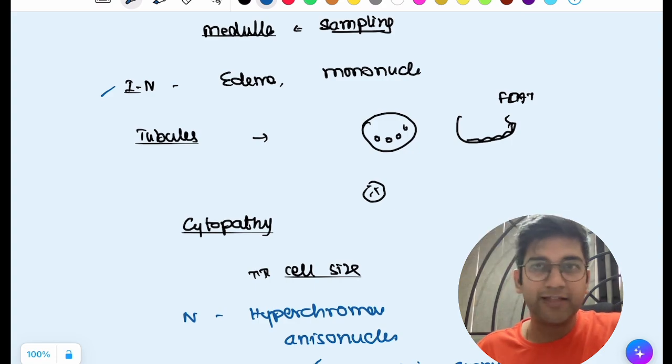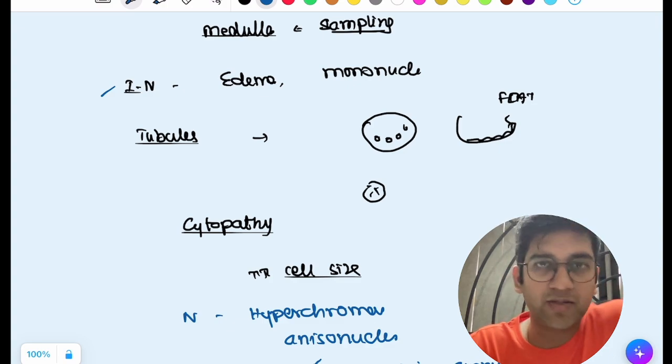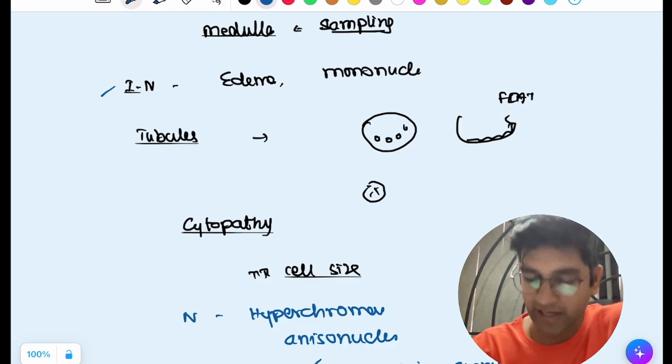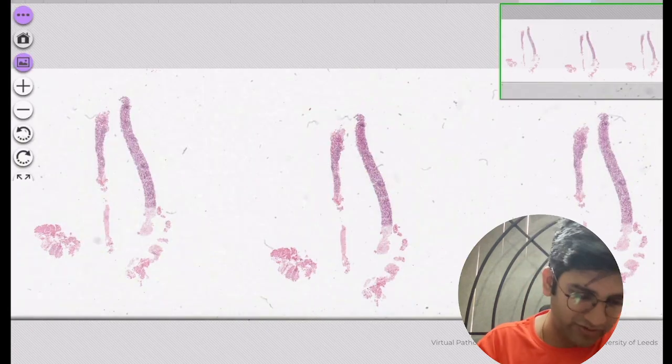Like I said, it doesn't end without us looking at the slides, and let's see if we can identify this, and also have an immunohistochemistry for the same, polyomavirus SV40 clone. Let's see if we can pick them up. It's a very simple diagnosis, right? Thanks to the slides. Slides are from the Leeds Pathology website. They have an amazing source of slides if you want to go and have a look at it, right?